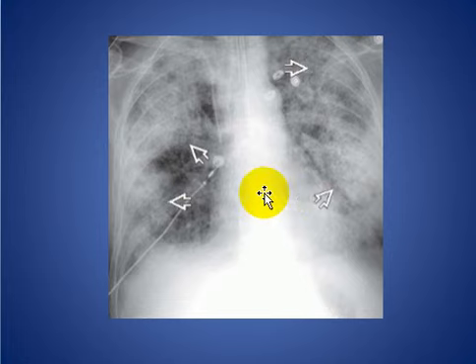Here we see chest X-ray shows typical findings of bilateral airspace consolidation and peripheral distribution with geographic area of centrally spared in patient with fat embolism syndrome. And it is following trauma to the long bones and the pelvis. And diagnosis is clinical.